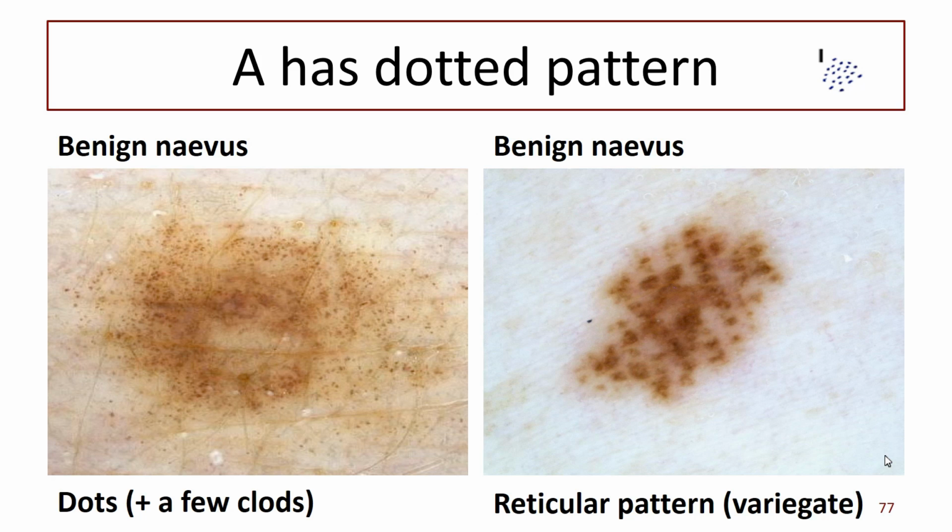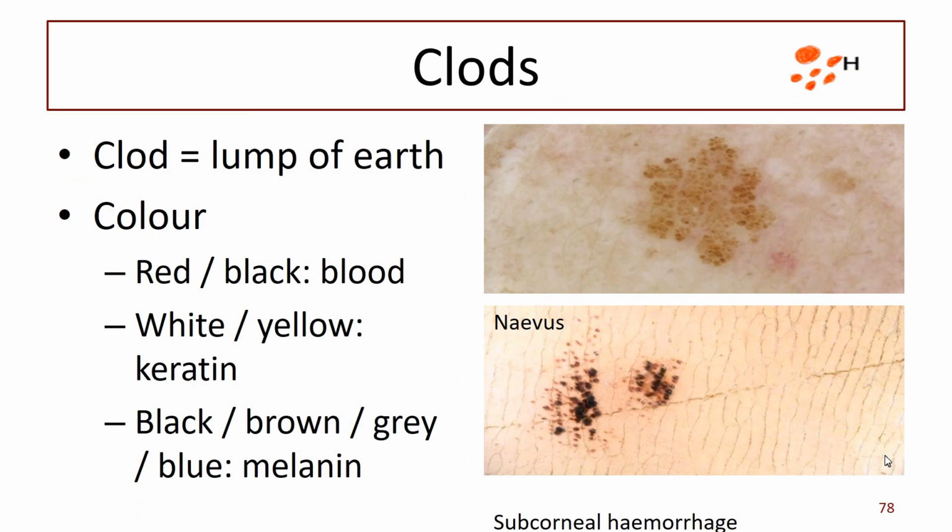Most of them returned to normal, some did not. The alteration of the reticular nevus was that it lost its clear reticular pattern. It became more fuzzy. So I can say that this nevus has probably had a bit of sun on it, and that's made it fuzzy, so you can't really see the reticular pattern anymore. Doesn't mean it's not a reticular nevus, it's just fuzzy.